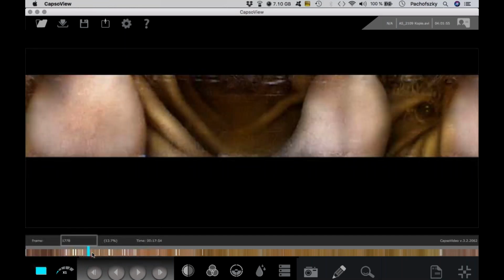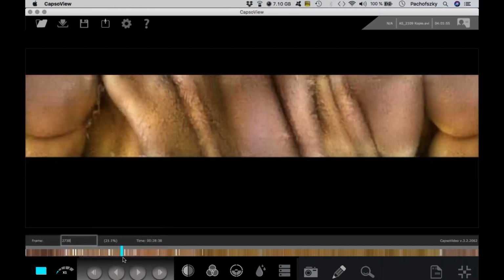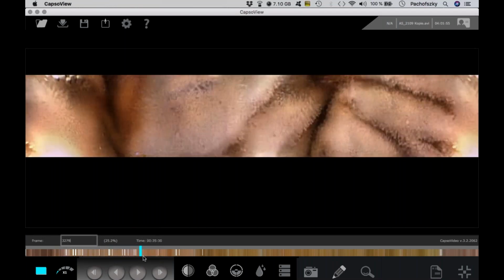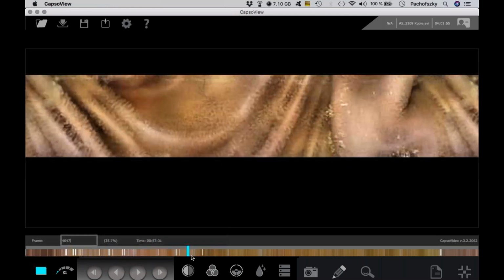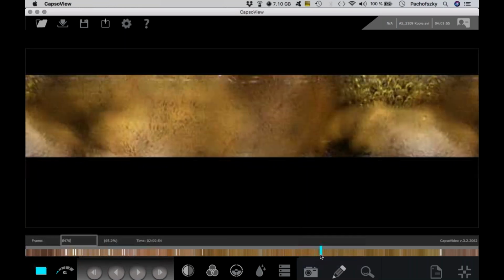We will look at it then if we look at the whole video. So you can see again, with this method, you can find the main pathologies within some seconds or minutes. So I'm going on. Even it's necessary to know if we have a complete examination.